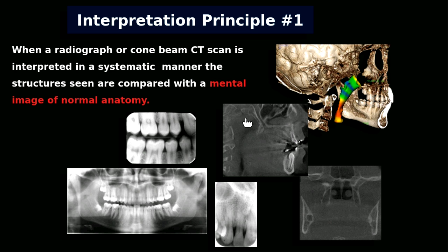In the CBCT, they want to evaluate the airway, and that's why you can see that. This is the sagittal view, and here is an important anatomical structure, the pterygomaxillary fissure, where the important nerve structure and the plexus go through this area. And this is the coronal view. This is the medial pterygoid, and that's the lateral pterygoid plate. So you have to know that.